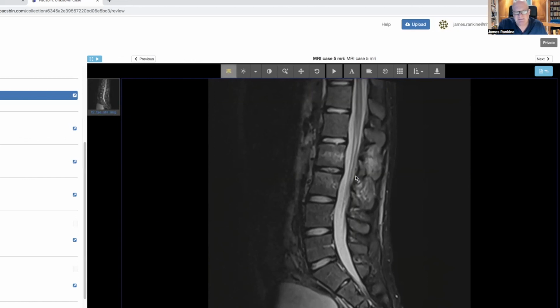And I got all of that information from the CT scan by the fact that I looked carefully on the coronal images and I could see that it was bent over. The alignment was abnormal in CT, and that's such an important thing to do. And the important principles here really are that you really want to make the diagnosis on the CT, because looking at the MR scan can be difficult. And if you can predict what you're going to find on the MR scan, if you know what you're going to find, you're much more likely to be able to make that diagnosis.